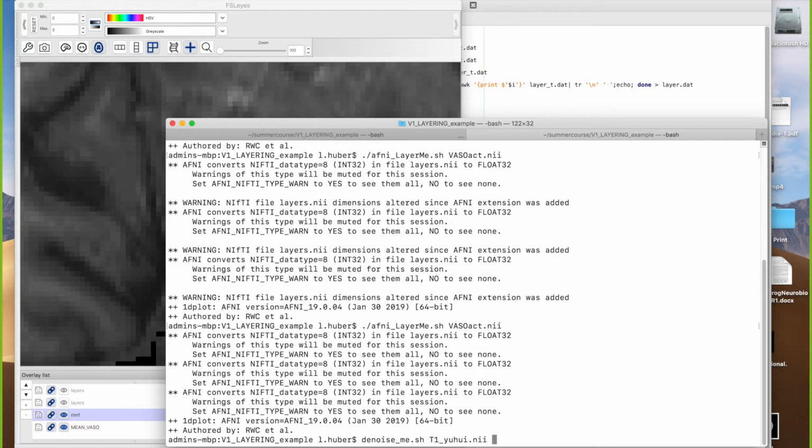But maybe I want to make a short break here and ask if you have any trouble executing LAYNII at this point, and whether or not you could generate your own layers on that data set. Yeah, it worked. Okay. It worked quick and easy. Okay, cool. But I don't have AFNI, so I couldn't do the last step.